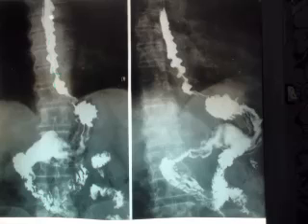Here, this is another problem of esophageal motility. Now we can see the esophagus has multiple areas of spasm and incoordination of its movement. It's an esophageal motility disorder as well, like achalasia, but achalasia affects only the lower end of the esophagus. This disorder is called corkscrew esophagus, where there is spasm at different levels of the esophageal wall along its whole length. It has the same symptoms as achalasia, like dysphagia.